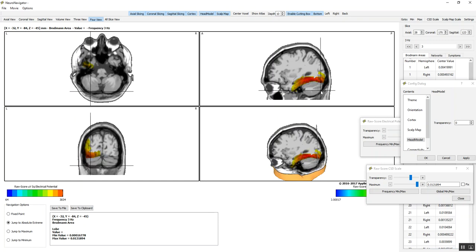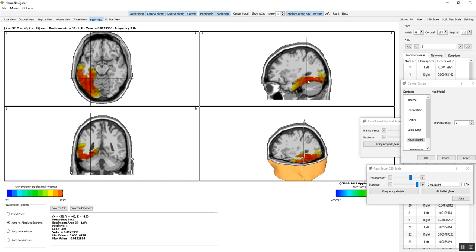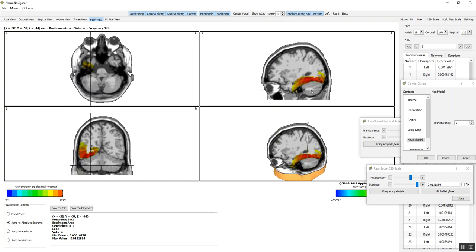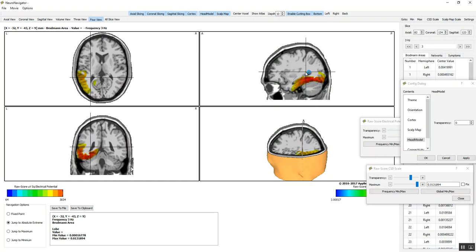You can uncover that. There's a cerebellum. We don't have any inverse solutions for the cerebellum, because of its lack of dipole synchrony with large masses, unlike the neocortex. We can look at the different aspects of this cutting tool. For example, I can just look at the left, or look at the right or the back of the head.